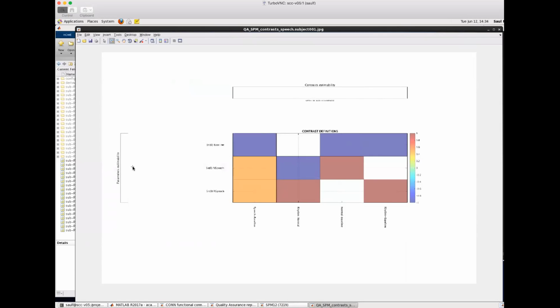And also sometimes you will see messages written in red and bold letters telling you that something is wrong for some reason. Those try to detect particular things that might have gone wrong in the estimation, and those could vary. You could have not enough degrees of freedom to estimate some of these things, or you could have a lot of combinations of non-estimable stuff.